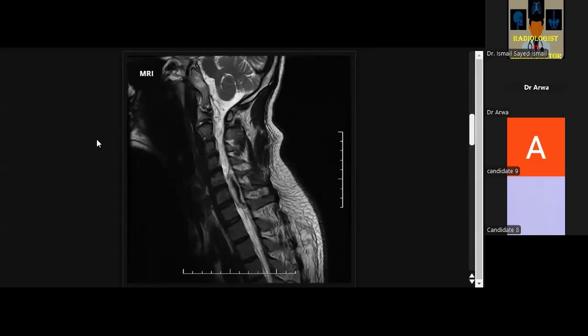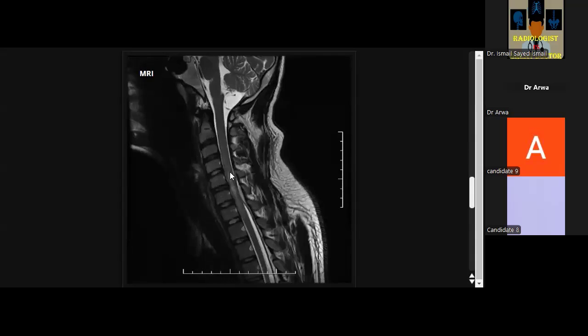And I would inform the surgical team about my findings, and I would correlate with the history of any trauma. However, I cannot see any vertebral compression fractures in the study. I would like to correlate with history of any previous anticoagulation or any procoagulative disorder in this patient. Yes, so very good. I would inform the neurosurgical department to release the mass effect on the cord because it is causing compression. However, I'm unable to see any intramedullary signal abnormality. I would like to go back. Okay, there is mild compression and minimal hyperintense signals within the cord representing cord edema. So it's an emergency to decompress this lesion.